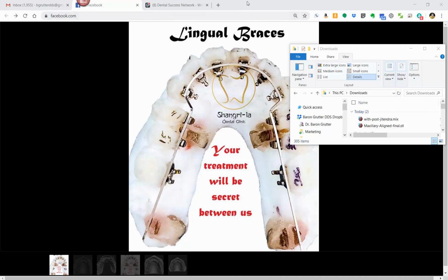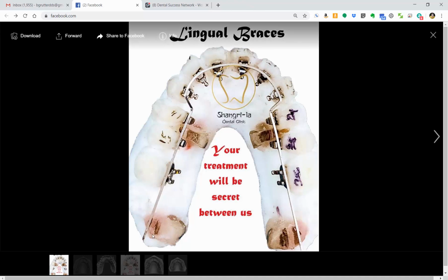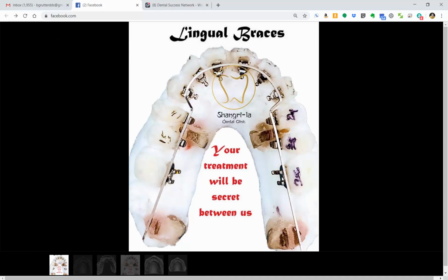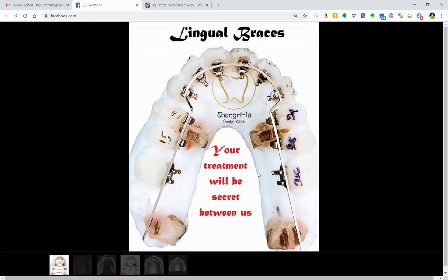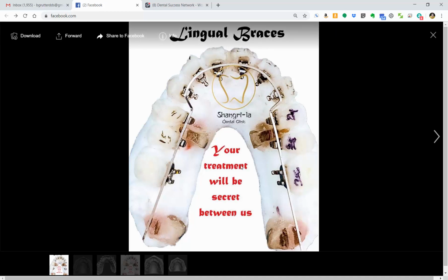Okay, so I just got asked how to digitally create a wire for lingual braces. Honestly, it's not something I do, but I like a challenge, so I thought I'd go ahead and make a quick video. Now, I haven't tried or practiced this, so you're going to see me thinking through the process. I don't want to think it all through and then make a video, because this is just a quick thing I'm going to do.